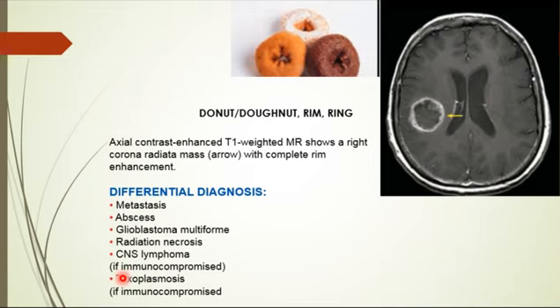Okay, which is the magic Dr. L. Okay, we heard a lot of this Dr. L. The ring enhancing pattern: organized abscesses have smooth rim enhancement with internal reduced diffusion. GBM shows a thick irregular rim enhancement with heterogeneous internal enhancement. Infarcts rarely demonstrate ring enhancement unless located in the deep gray matter. It's just the magic Dr. L going over it, okay?